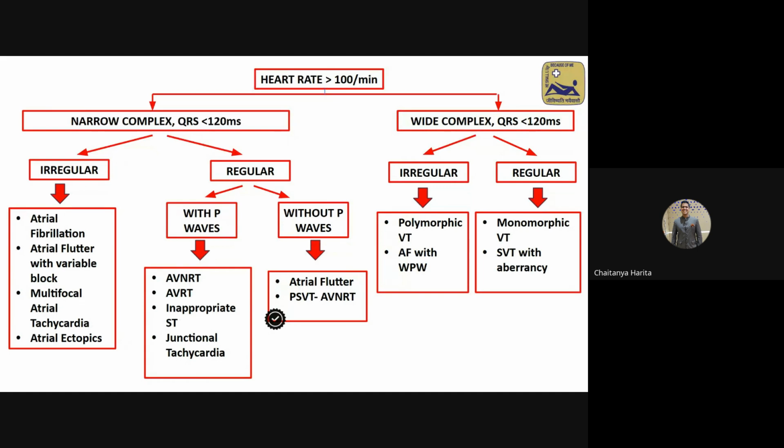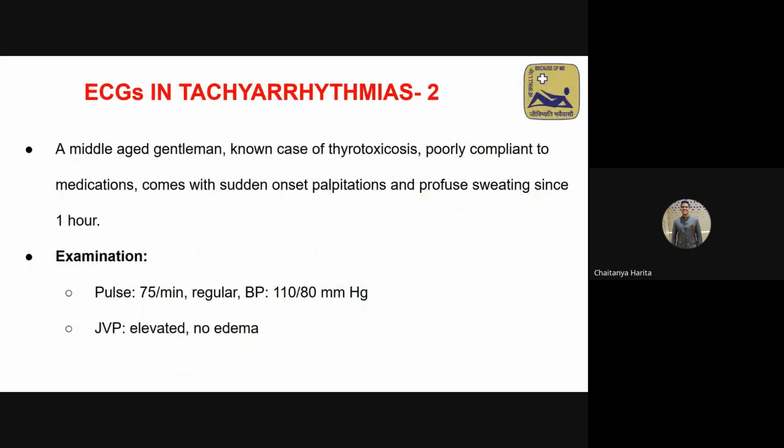So this is PSVT. Second ECG. A middle-aged gentleman who's a known case of thyrotoxicosis. Nathaniel, you raised your hand. Sorry, go ahead.